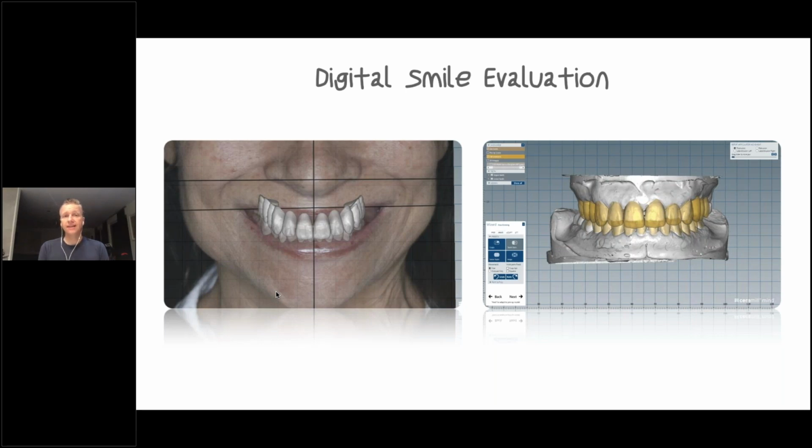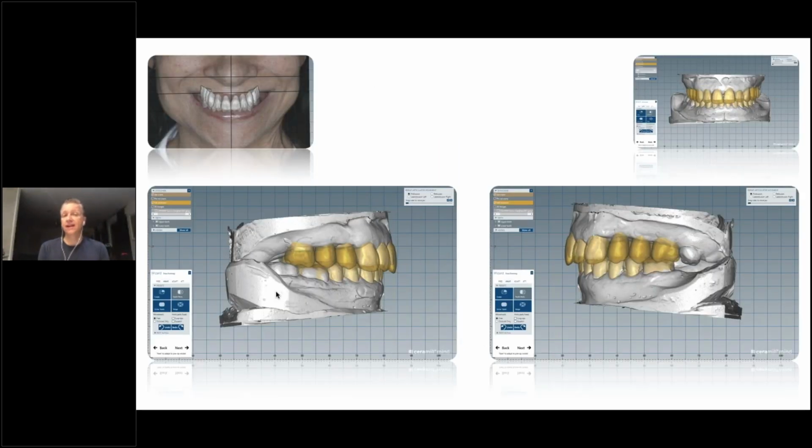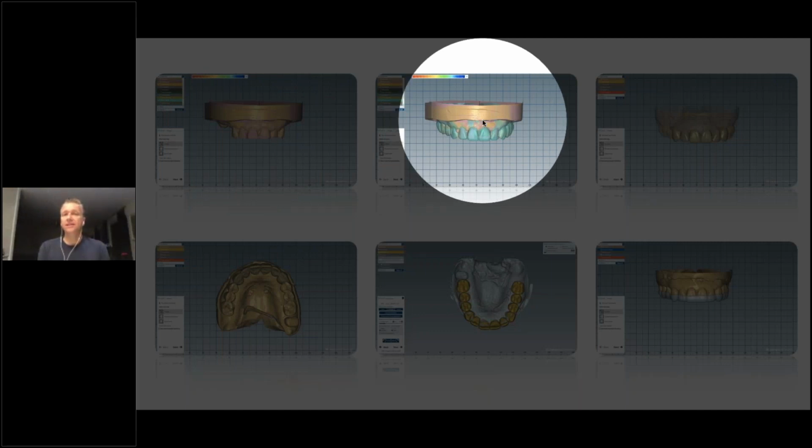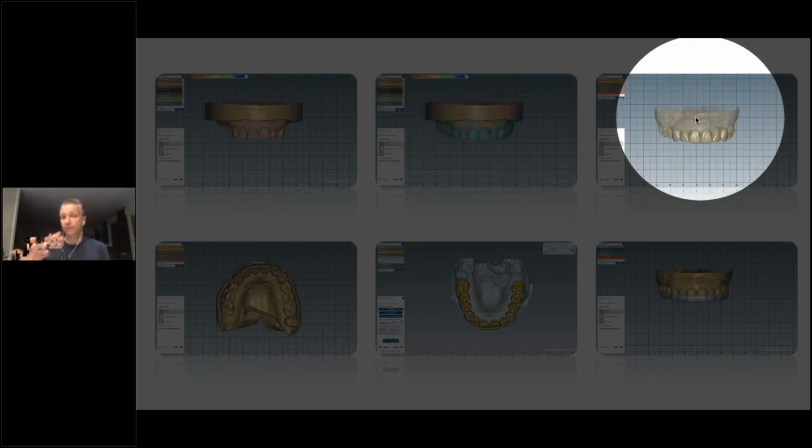Now we can start creating a nice restoration for the maxilla. We designed this 3-dimensional diagnostics, and now we see we have appropriately sized teeth. It allows us to design, from an implant scan or an implant impression, these 2 3-unit bridges on each side. And for the upper anteriors, we're preparing for 6 anterior crowns. If you look from left to right, this is the initial situation, this is our draft, our diagnostic digital wax-up, and here is the design of the final restoration.